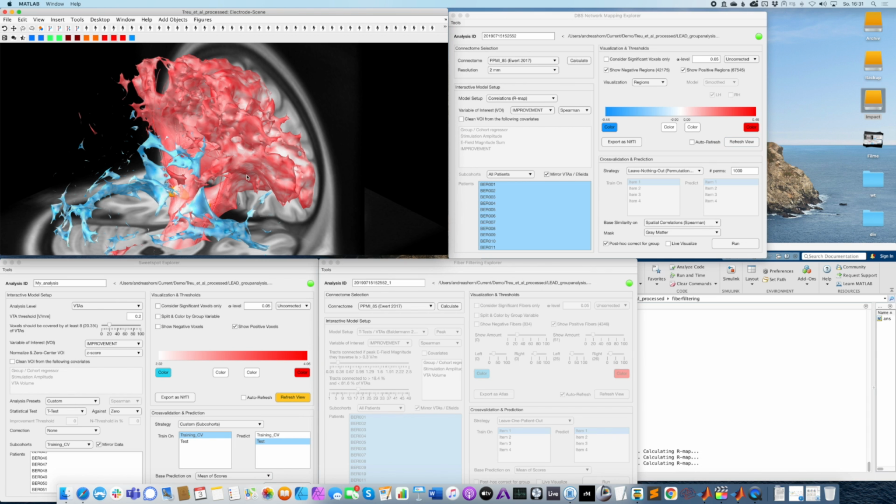Right, so it's not as beautiful as you can see, but again, sometimes, especially in functional MRI or so, it can be really helpful because it could, for example, also identify, say, a region in the claustrum or putamen or so, right? So something that you would not see on the surface. So we'll go back to showing it as a surface.